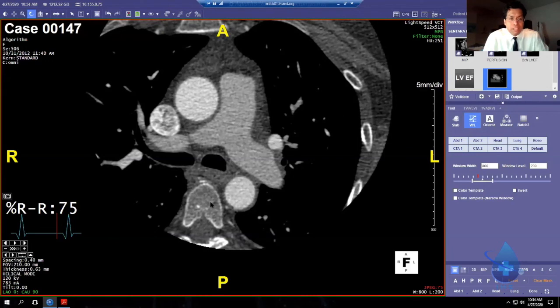Is it coming back to you from radiology from a long time ago? Okay. This is the part of the training where if you're a radiologist, you're incredibly bored because it's like 101. But if you're a cardiologist, you probably need a little refresher on this. Any questions about window width and window levels?